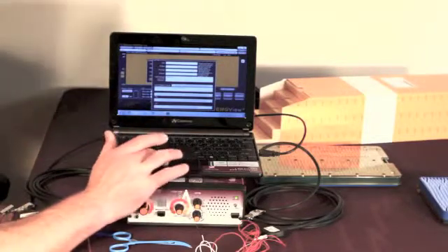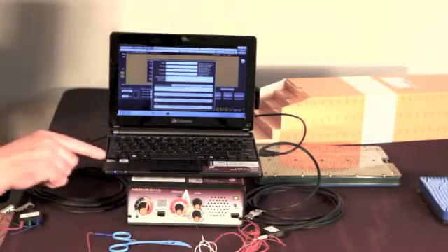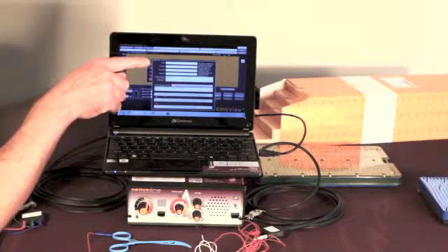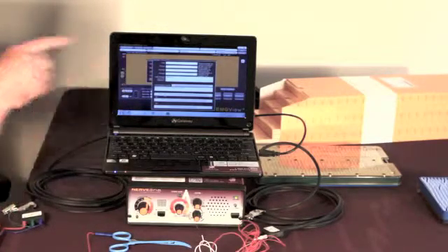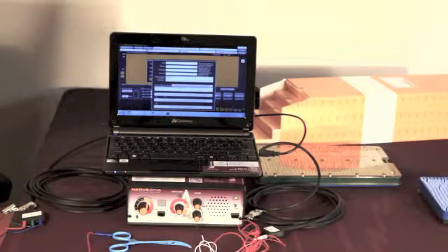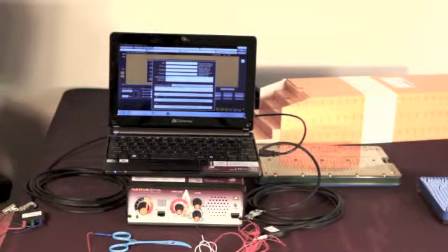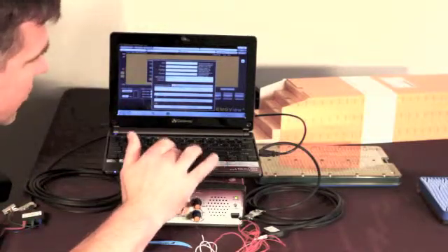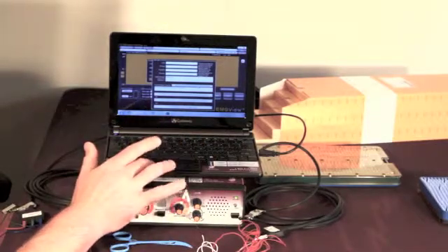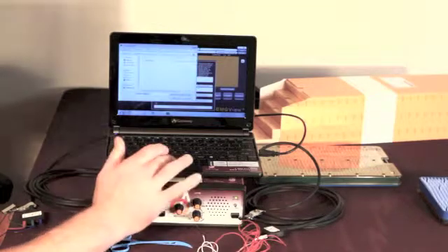I'm going to go ahead for the moment. We'll go ahead and start a case and record. Oh, and one other point I want to make is that you're able to add patient ID information, any notes, who the surgeon is, what the procedure is, and you can also choose where to save the file on the computer. And in fact, I'm going to go ahead and change that right now because I've created a location on the desktop where I'd like to save my recording of this case.